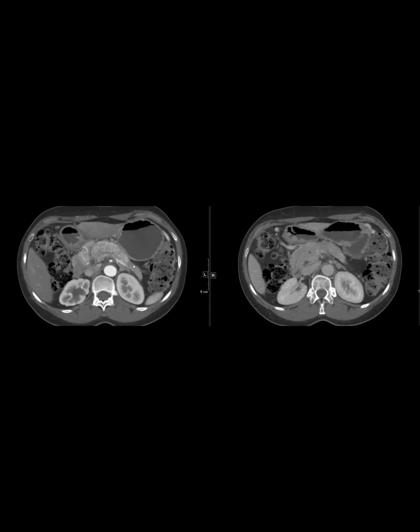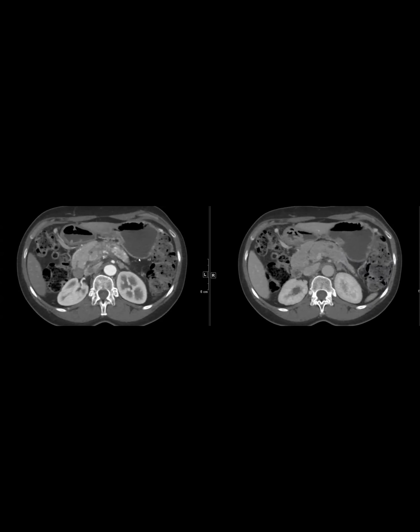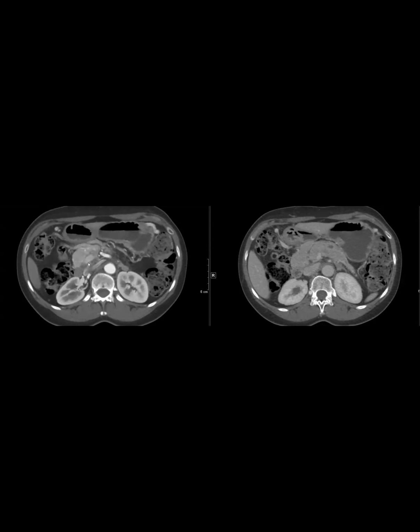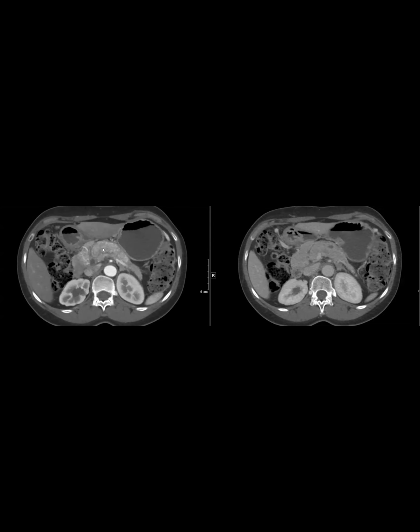It's confusing because the part that ends up ventral is called the dorsal pancreas because of the rotation. But that piece that you just showed is technically called the dorsal, right? I think you're right. I always get confused. Yeah, that's the dorsal one. Right. You can see that this dorsal bud is okay, but in the ventral bud, you can see that there's an enhancing mass, which kind of follows.